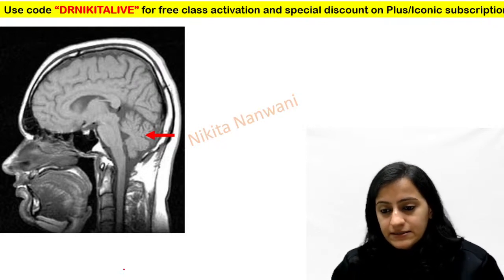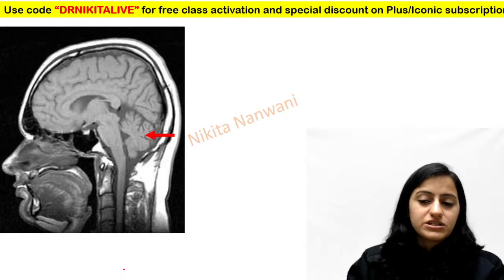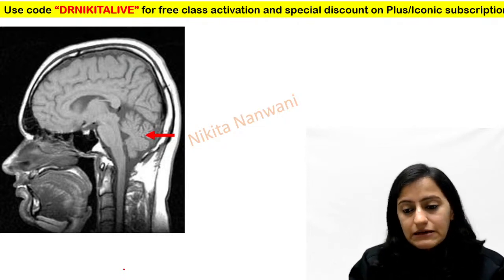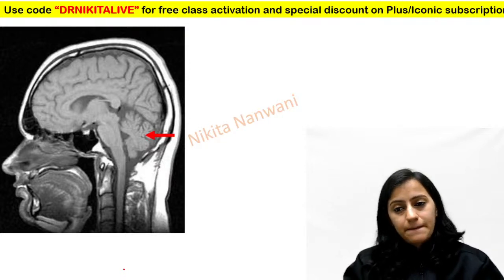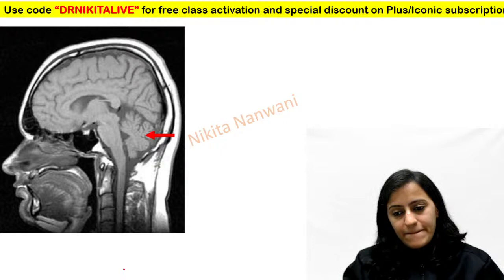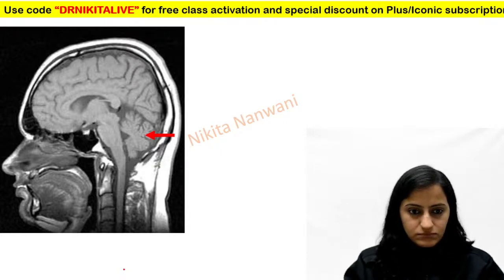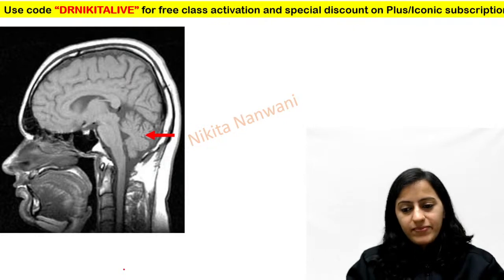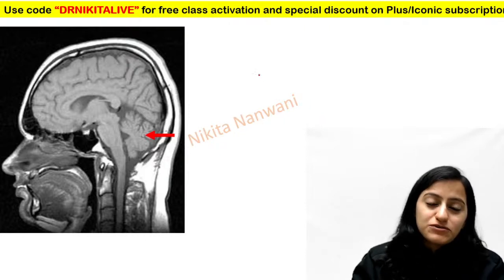Okay, let's go, tell me. This is just one question that I've put here because this is very important. The mid sagittal image of the brain. First you need to tell me whether this is a CT scan or an MRI. Is this a CT or is this an MRI? Okay, I see few students saying CT, few students saying MRI, so there's a confusion.